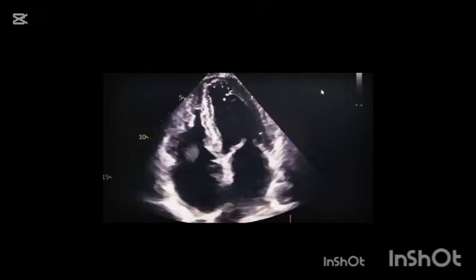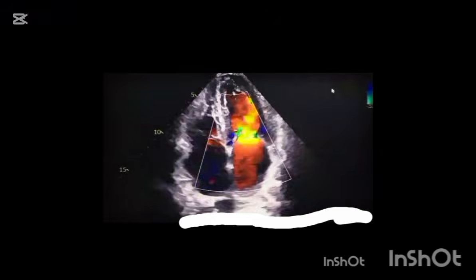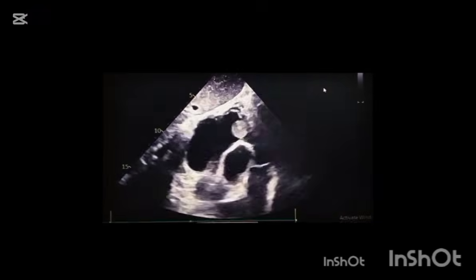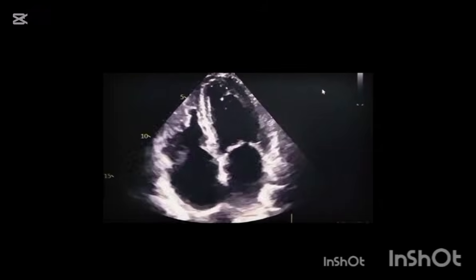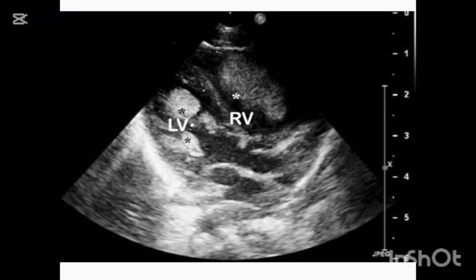Making this distinction is difficult because of the similarity in the echocardiographic appearance. A correct diagnosis depends on the clinical setting, that is, the presence or absence of infection. These tumors usually attach to the wall by a small pedicle, with a delicate frond-like surface, and mobility is common.